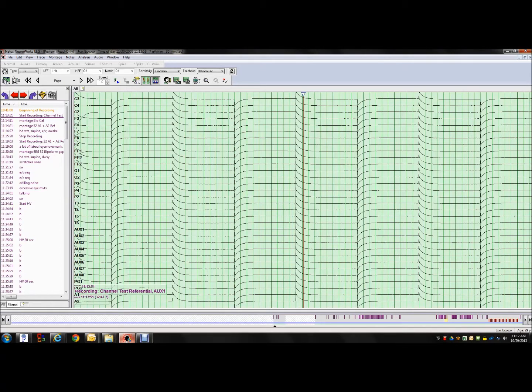Okay, so what I'm going to do is review this EEG, which is EEG 2. I'll point out the various artifacts, but there's one main artifact in here that's of interest, and I'll point out that in EEG 1 there's also a main artifact of interest. What I'm looking for in EEG 1 is something other than simple EKG artifact or eye movement artifact, that you would typically see on every EEG. I want you to find a more unique artifact that you might only see for the first time on that EEG. So make sure you hunt a little bit and figure that out.